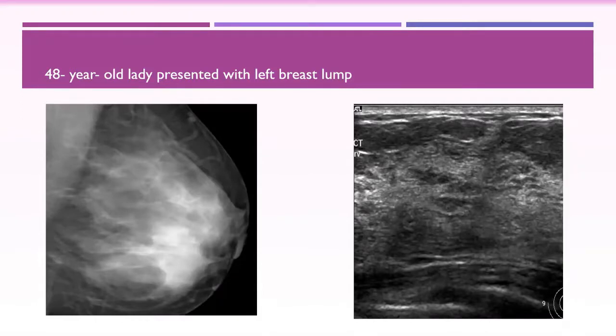Seen usually in fibrocystic change, we call it a fibrous ridge. It is a very common cause of palpable abnormality. You see, during practice you might be faced by this type, and usually ask the patient to put her finger and put your probe. You will see variable sizes of this type of palpable fibrous ridge. Most breast ultrasounds are reported as normal findings while the patient has a palpable abnormality. If retrospectively you search, you will find it is a fibrous ridge.